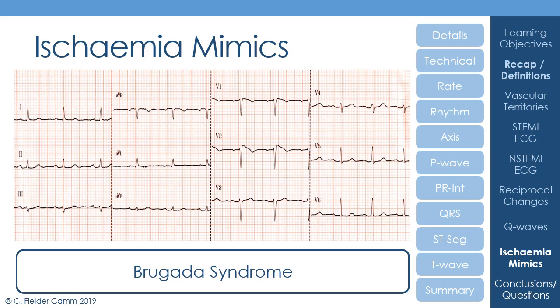And you may see this if you do an A&E job. People can come in with a fever and suddenly get these ECG findings they don't otherwise have. And it is something to take note of. And I think this is one of those pattern recognition things that V2, particularly in this case, is absolutely classic for Brugada syndrome.